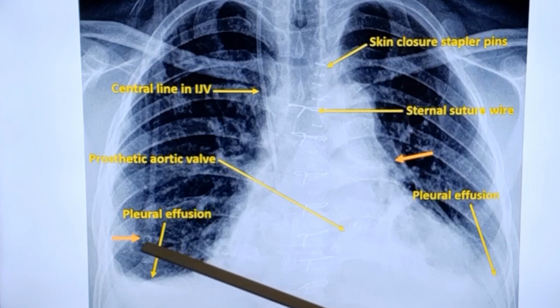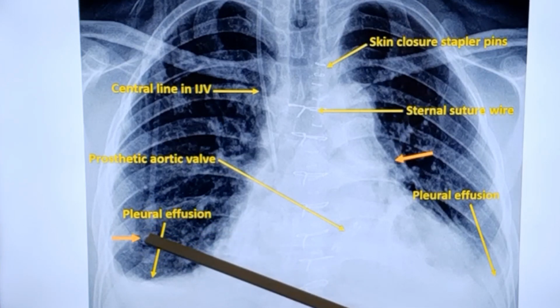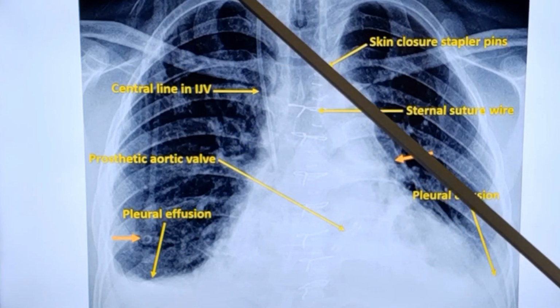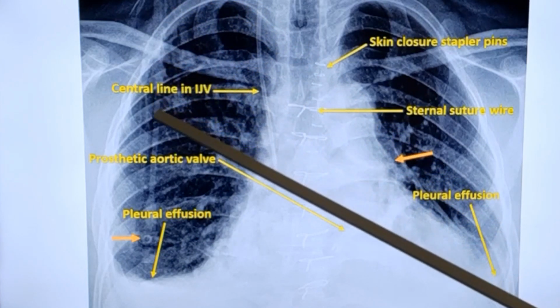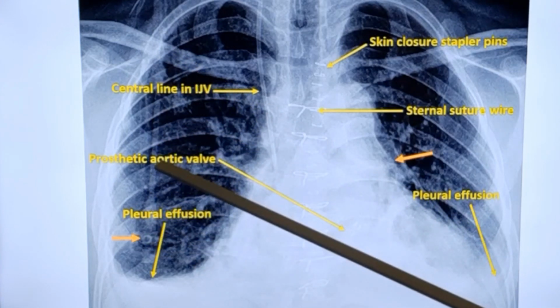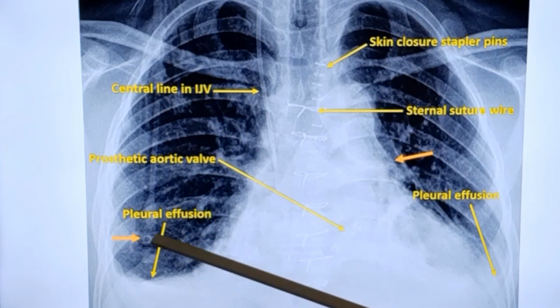And another subtle finding is this. This could be the end of this catheter. The upper part is not seen. The external part of the catheter over the skin is probably what you are seeing here.